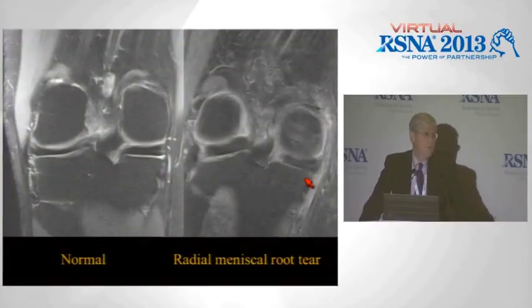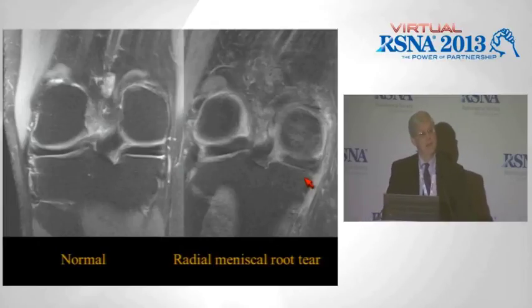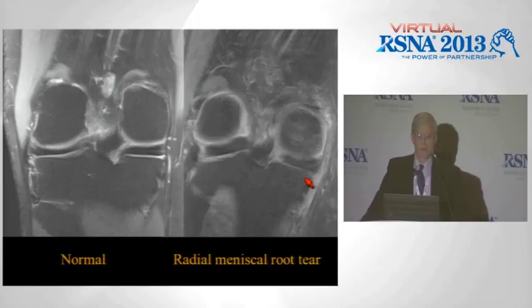The meniscal roots, there are both anterior and posterior roots. We tend to concentrate on the posterior roots, and there were several talks about the roots both anteriorly and posteriorly, and some people may now refer to them as the meniscal root ligaments. The posterior roots attach the meniscus to that midline. And so on posterior images, as is shown here, normally on the left side, you should always see meniscal tissue on your two most posterior images through your meniscus extend toward the base of the tibial spine.